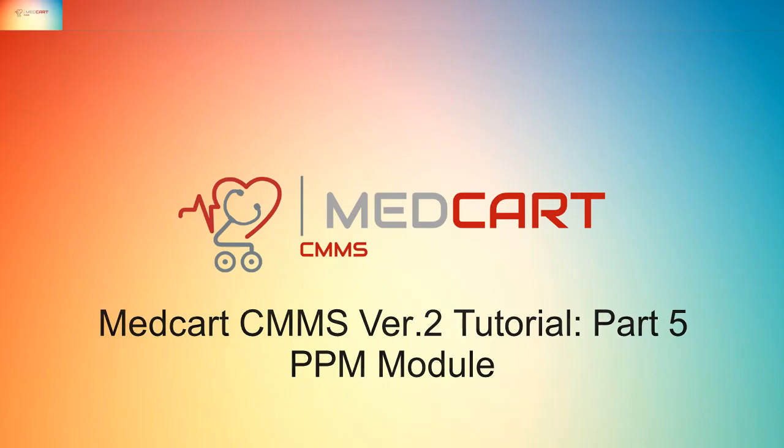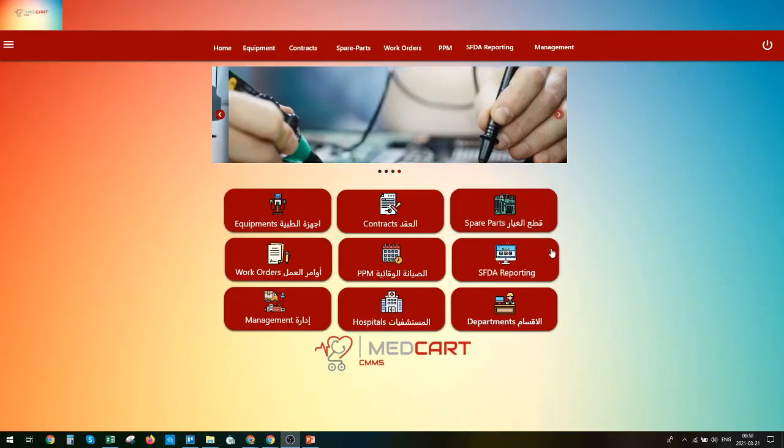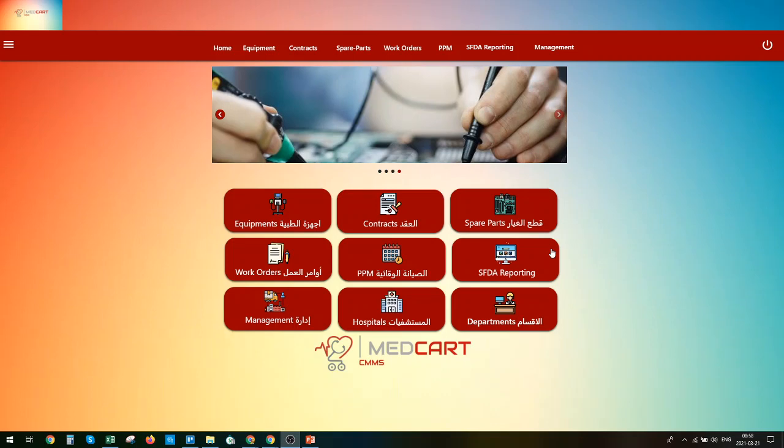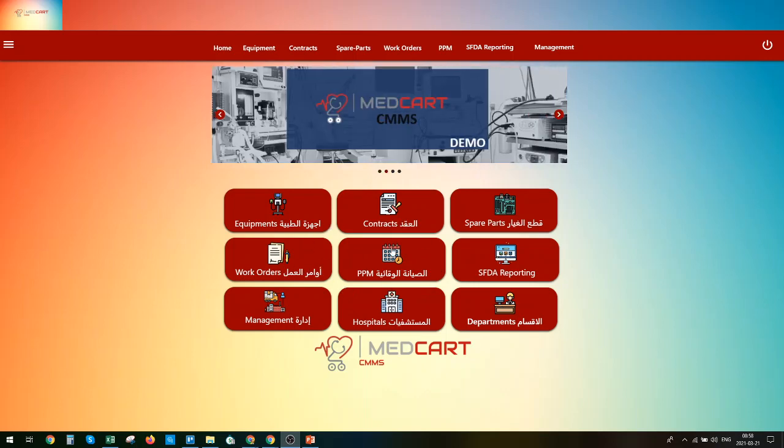So for today, we will learn how to see the function of our PPM. We're done with the equipments, contracts, spare parts, and work orders. So let's go to the PPM module.